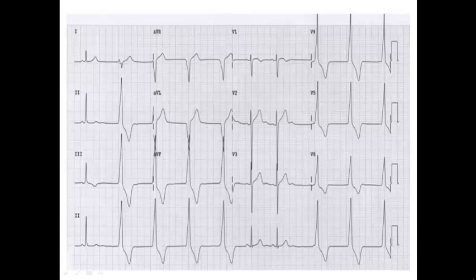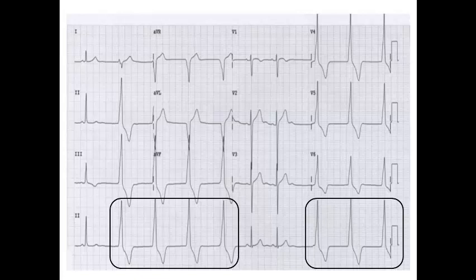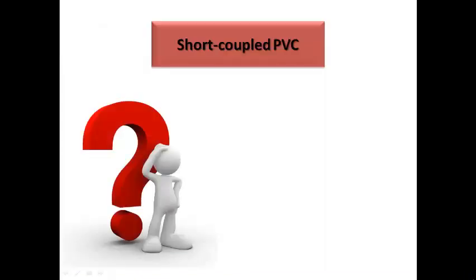So here in this example, we can see that the patient has a wide complex rhythm. Of course, the heart rate is less than 100, so it is not tachycardia, and it's still above 50 beats per minute, so it is not an escape ventricular rhythm. There is complete AV dissociation during this rhythm: during sinus rhythm there is a one-to-one AV relationship, but during the wide complex rhythm there is no consistent AV relationship. So we can say the patient has intermittent accelerated idioventricular rhythm, or, as an abbreviation, intermittent IVR.